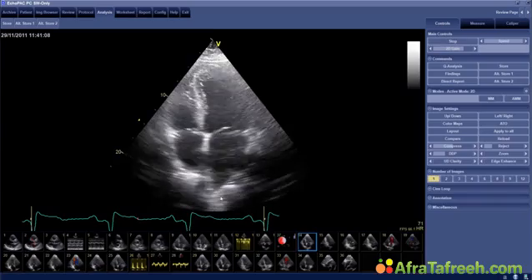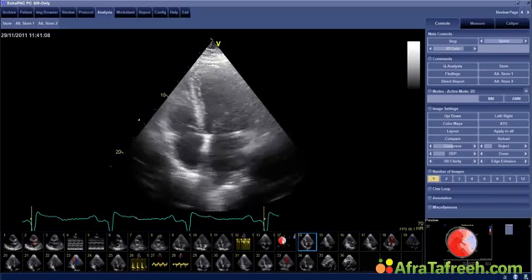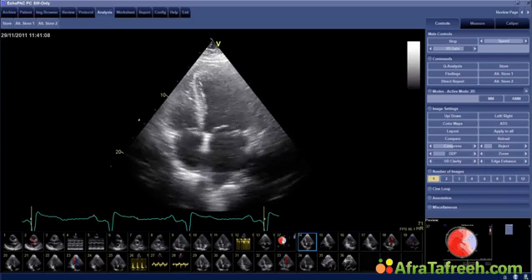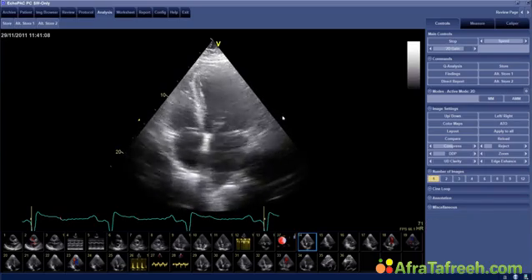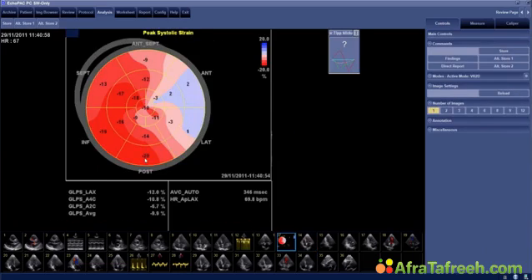Now let me go back to the echo images again and show you one thing that the users that were with me the last time already know, which is a technique we call speckle tracking, which allows us to look at longitudinal function. I showed you that longitudinal function can be looked at in a global way, but you can also look at it in the different segments and see how the regional wall motion is with respect to longitudinal function. Here we have the apical regions, the midventricular regions, and the basal regions. This would be anterior septum, posterior, inferior septal, anterior, and lateral.